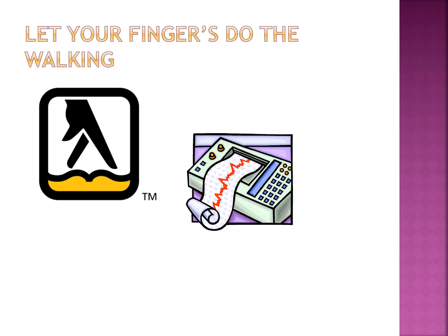So we're going to let our fingers do the walking and do the talking and figure out the axis deviation, because don't make me count boxes and figure it out by that little star pattern that we saw at the beginning of this section, because I can't do it, but I can let my fingers do it.